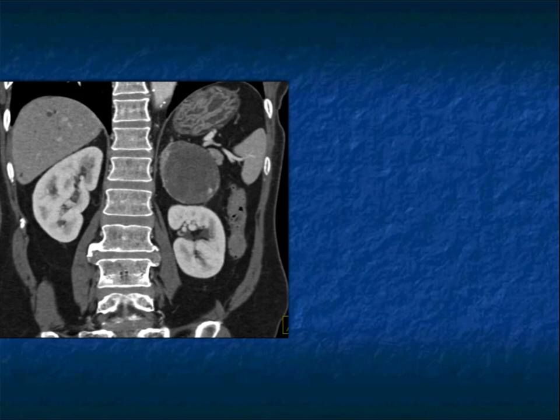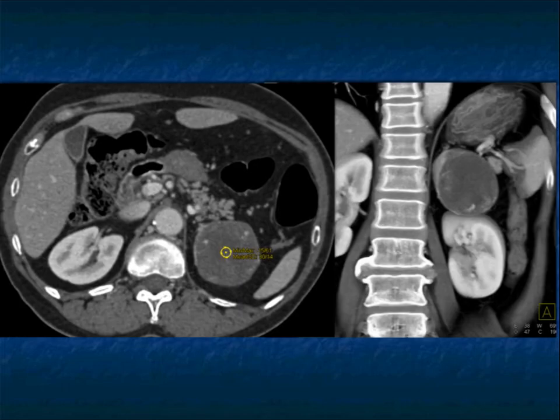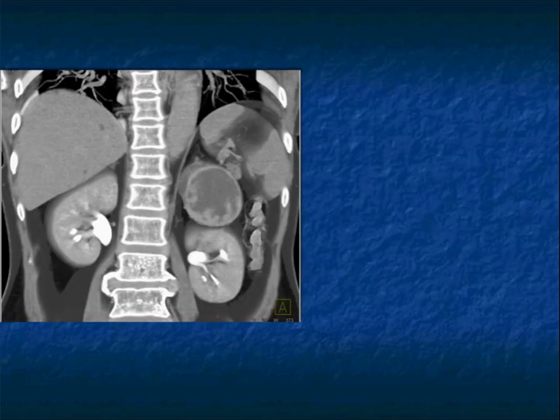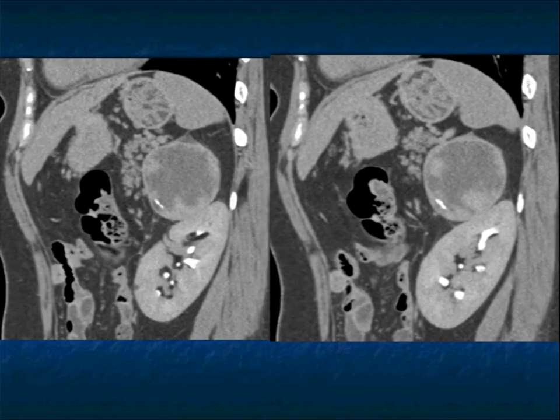And then you say to yourself, what could this be? It really doesn't look like a carcinoma, but it doesn't look like an adenoma. We do have certain benign lesions like hemangioma, could be, they're very rare. It doesn't look like a myelolipoma. Well, what is this? You can see the washout. You can see some increased puddling in the lesion. There's this vascularity, but there's a large cystic component. And you look at it again, it has a pseudocapsule to it. What could this be? Well, this was a pheochromocytoma, a cystic pheochromocytoma.